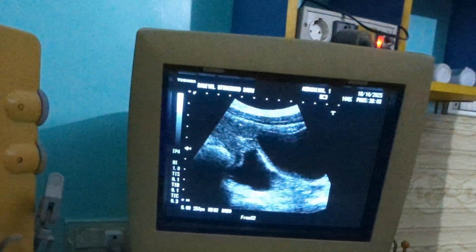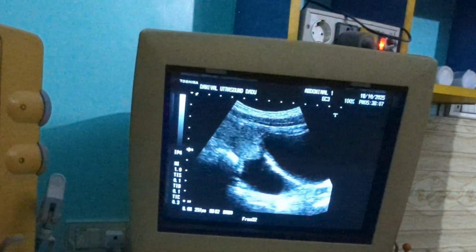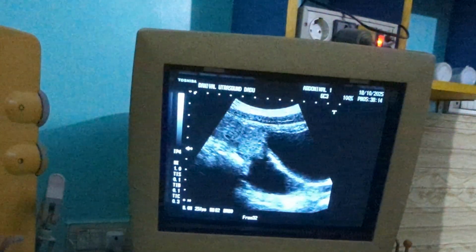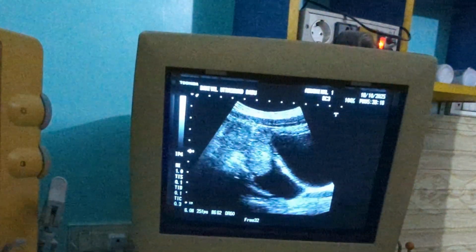We have discussed a lot about the causes and consistency of the peritoneal fluid. Though this is a rare topic, I thought it suitable to share with the students or the people or the doctors who are interested in this field.